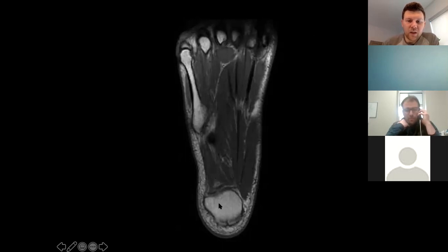When we're looking, we talked about the calcaneus the other day, right? Last week. Mm-hmm. So which tubercle is this one? Your medial tubercle. And then this one is? Lateral. Okay, so that's why on an x-ray we can see the medial one more prominent and more plantar, and the lateral one's just going to be that little remnant that looks more radio-opaque on the x-ray.